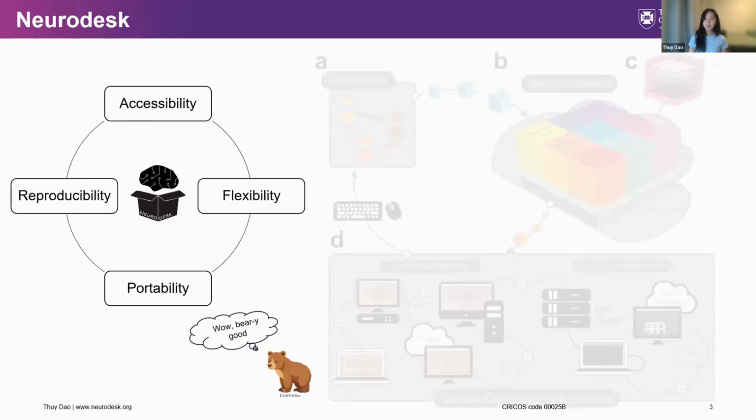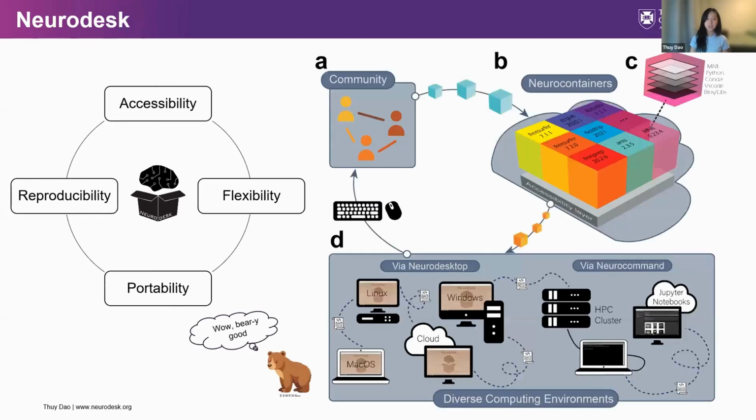Our platform leverages container technology, which lives in our Neurocontainers here, so that it can isolate tools in separate environments. By that, it eliminates dependency conflicts and also ensures consistent results for your analysis. We also provide three interfaces to fit your preferences.